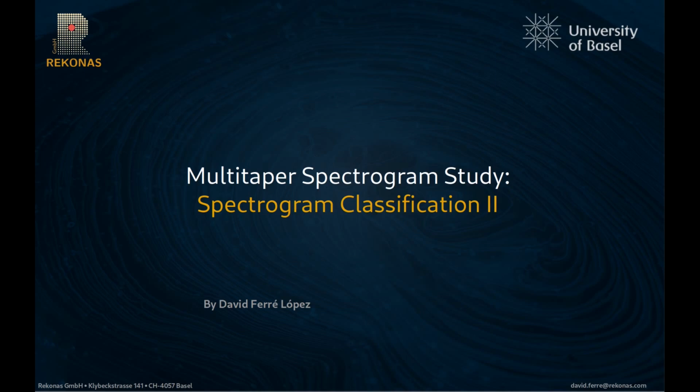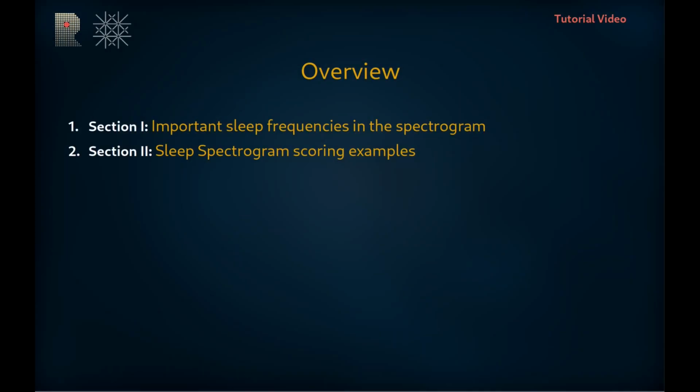The Spectrogram Classification Part 2. The tutorial starts with an explanation of the significance of specific frequencies in understanding different sleep phases. Moving on to Section 2, the tutorial concludes with illustrative examples of sleep spectrograms.